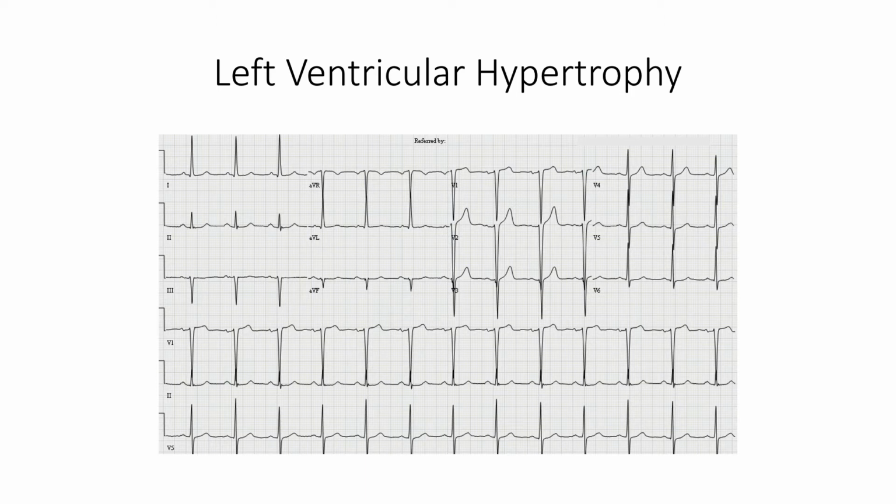On the ECG, there are a ton of different criteria that can be used to suggest LV hypertrophy, but it's really not that efficient to apply them all in each situation. I found that by looking at 2 criteria, this should be enough in most situations.